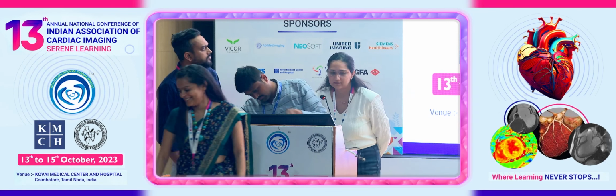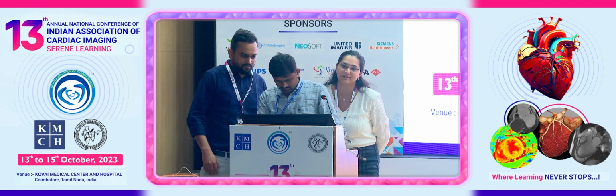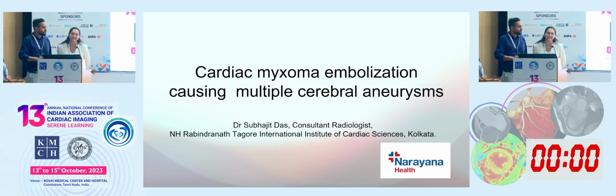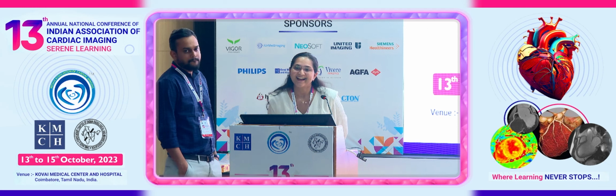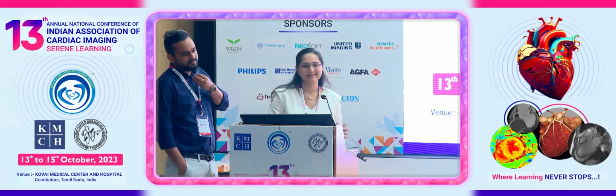So the aneurysm is the mole. We think that it is working within the heart, but it is actually working outside it. It's from the coronary. So many laymen say a hole in the heart, a hole in the heart. So I have a mole in the heart. Okay. See, I had to introduce such a twist in a relatively simple case.